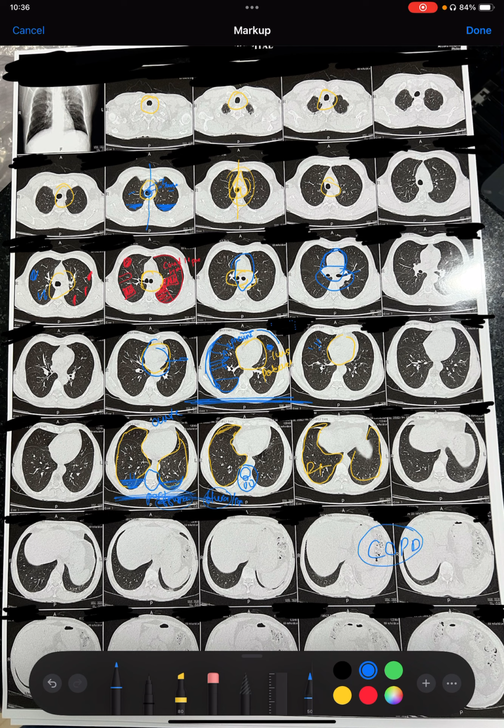Why? Because in COPD, we very commonly get a barrel-shaped chest. We must remember normal chest, the horizontal diameter is always more than the vertical diameter. But in barrel-shaped chest, as we know, it is a barrel. Barrel is almost completely circular.